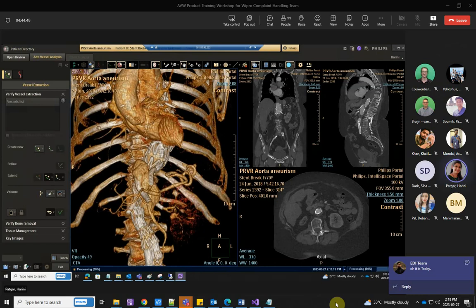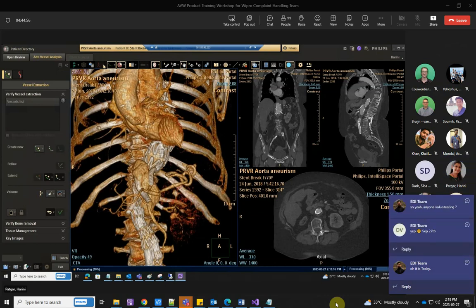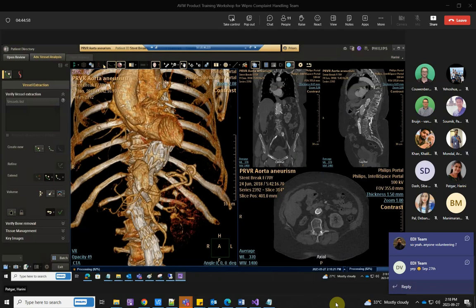And we have a calculate option here. Some calcium option is there. I will try to show you that also. This one part is a little time consuming. Otherwise, this application is smooth across.